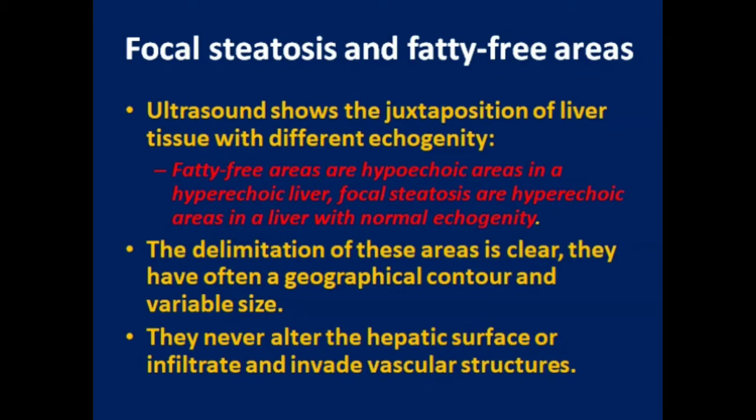There is another term used, focal steatosis or fatty-free areas. Ultrasound shows the juxtaposition of liver tissue with different echogenicity. Fatty-free areas are hypoechoic areas in a hyperechoic liver, while focal steatosis areas are hyperechoic areas in a liver with normal echogenicity.